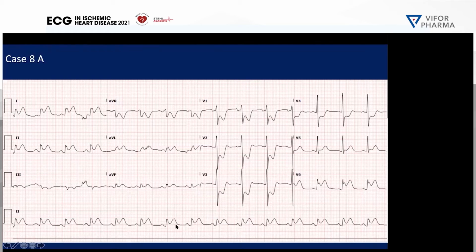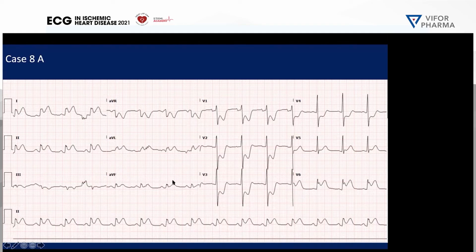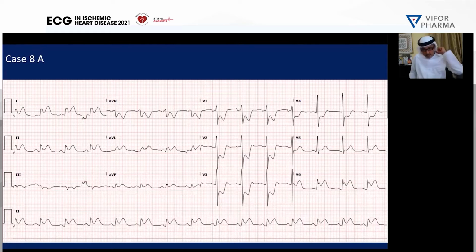What's your comment on the segment, Dr. Zubaidi? So segments, usually we say PR segment, ST segment, but for tonight, we're focused on the ST segment. And the first thing, of course, striking is ST depression in V1, V2, V3, V4, and then there's some ST elevation involving leads 2, 3, AVF, and maybe lead 1 and AVR. There's a lot of movement, but this ECG is suggestive of inferior and posterior infarction.